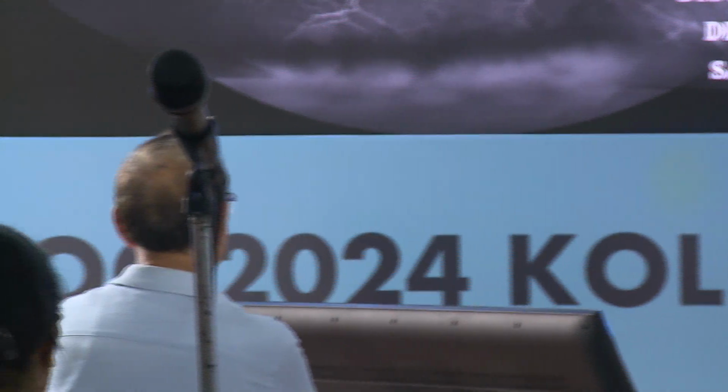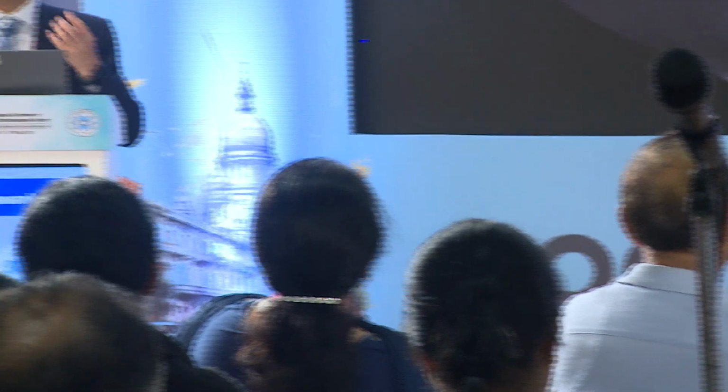So I would be taking you through this. We have already been introduced to widefield angiography as well as widefield OCT. This is a bouquet of clinical cases which I would be sharing with you to show why widefield imaging is the need of the hour.